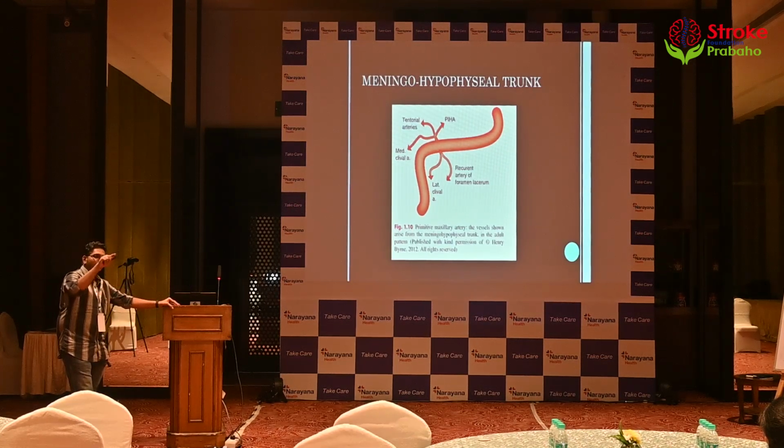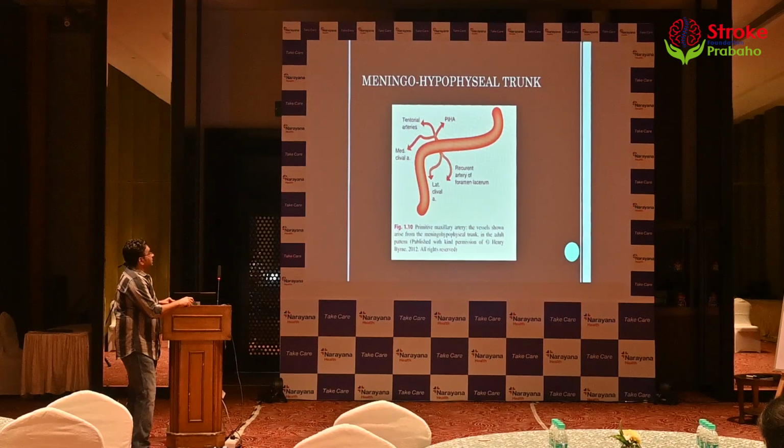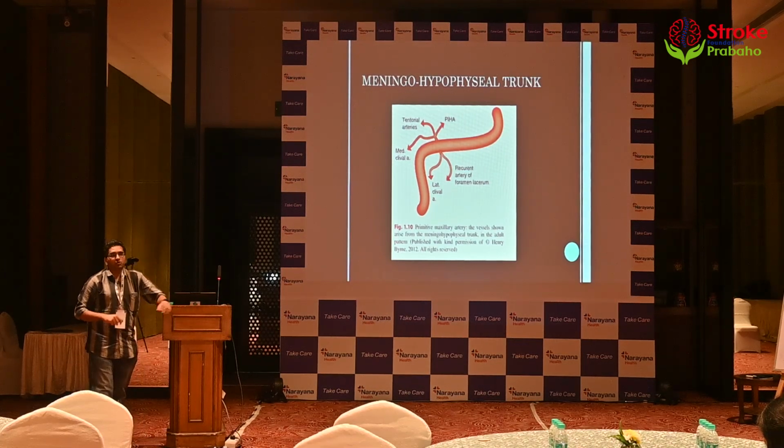Imagine the carotid canal and the carotid siphon. So ILT starts much more anteriorly: orbit, lateral, inferior. Meningo-hypophyseal more towards the posterior genu: posterior, medial, maybe posterolateral a little bit. How do I then identify the branches? Hypophyseal trunks, easy, because it goes medially, so it gives rise to the pituitary blush. Then you've got the clival and the tentorial branches. How do I then differentiate that?